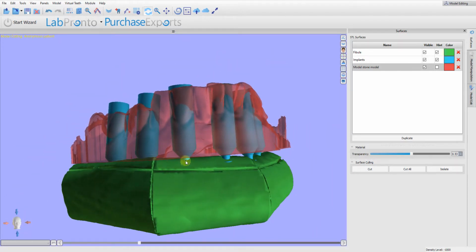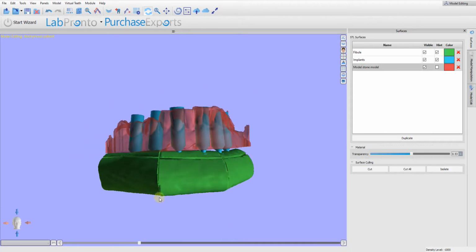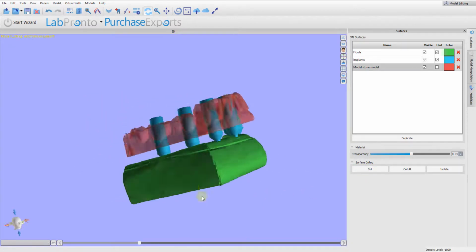And I'd like to have that not buried completely inside the prosthesis. So what I'm going to do here is I'm choosing the red again, and I'm going to use this cut tool. And again, doing it where now I can kind of see where the bottom of the temp coping is going to be, to make sure those are not embedded up in the prosthesis. We're going to make a cut across here. Good. And that's probably pretty good there.